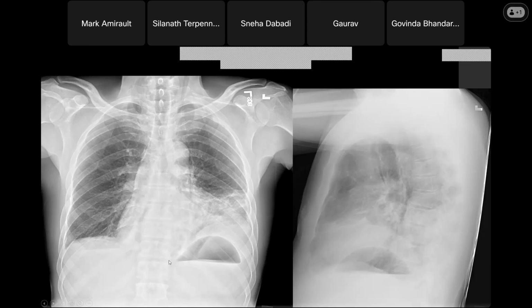And just to finish up here, so we talked about this a little bit with the gas we see, but the right heart border, so right atrium, looks nice. Aortic arch, there's some lucency there, but it looks normal. I don't see an abnormal contour here to suggest there's an aneurysm in the aorta. Don't really see the left heart border very well. So that's what we call a silhouette sign from these opacities here. But I don't see a pneumothorax, so that would be like gas, like a line here.